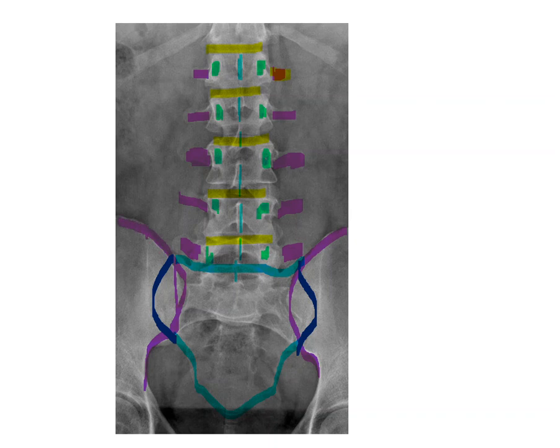Also, we will look for the SI joints to be symmetrical. We can look for the ilium, what part of it we can see there, to be symmetrical. Note that would demonstrate no rotation. Down here we have the femoral heads. We can look for those to be symmetrical.